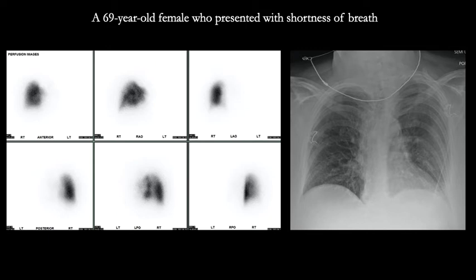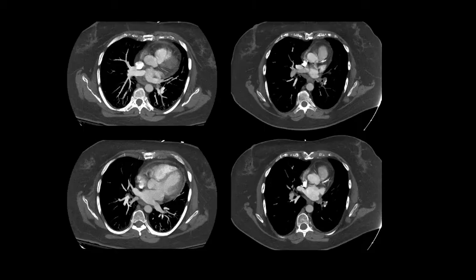And so the answer was evident looking back in the patient's chart, their prior imaging studies, and so these two images are from their CT scan showing patent left superior and inferior pulmonary vein and their branches. And then this patient underwent pulmonary vein ablation for treatment of atrial fibrillation, and after that procedure, there is occlusion of the superior and inferior pulmonary veins secondary to thrombosis.